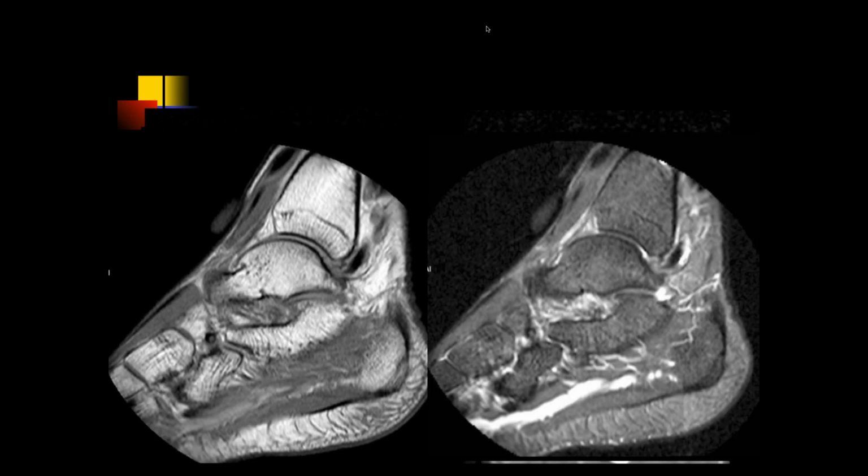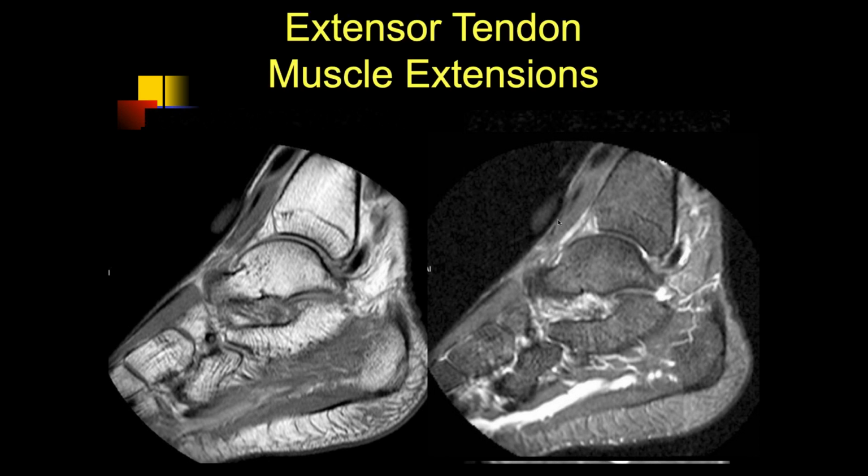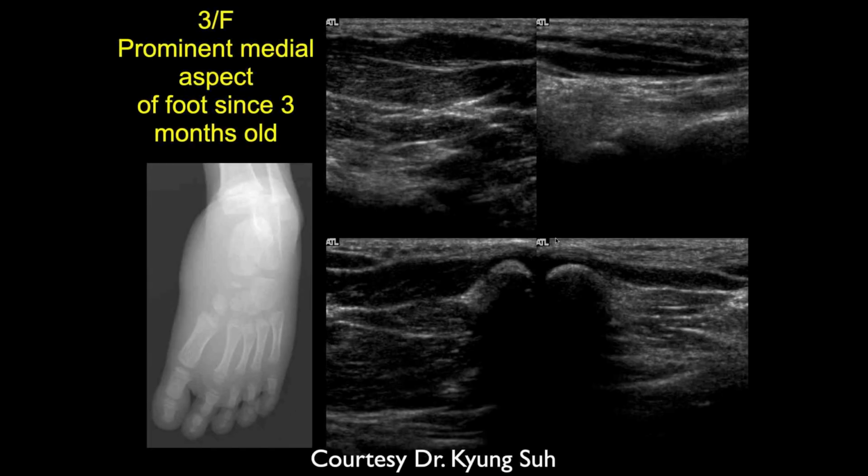Where we normally should see tendon, we're getting muscle coming down along the tendons. There's the anterior retinaculum in this location, which makes it a confined space, and so you can occasionally get symptoms because of the congenital anomaly where the muscles extend down into the extensor retinacular area, producing ischemic changes in that area as well.